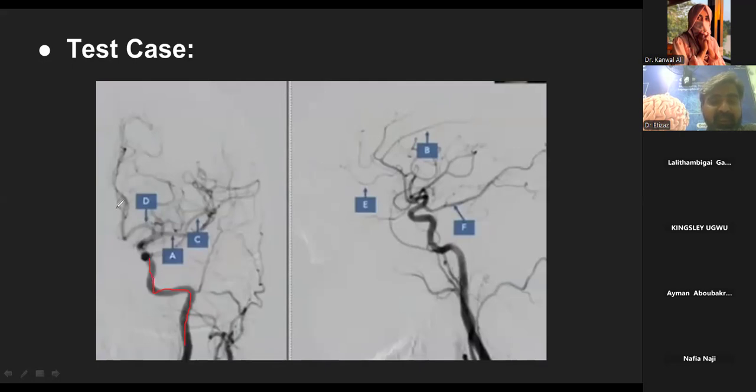This is ACA. This is ACA. This is MCA. So this is coronal cut. In coronal view sense, you can say this is the AP. This is the AP view. It's not oblique. Oblique will be a little bit tilted. Okay, so this is the AP view.